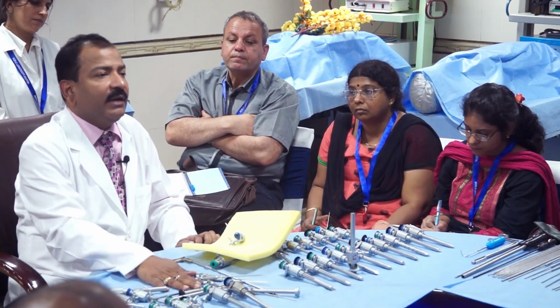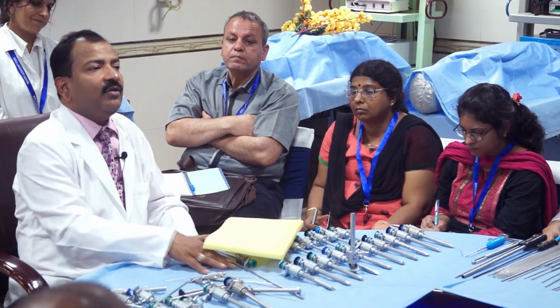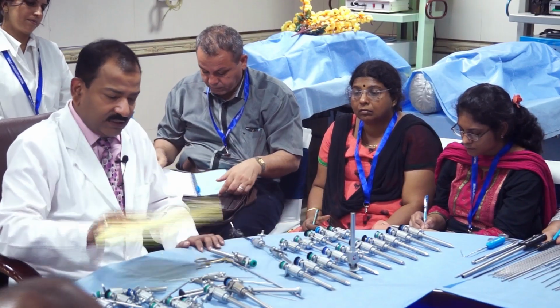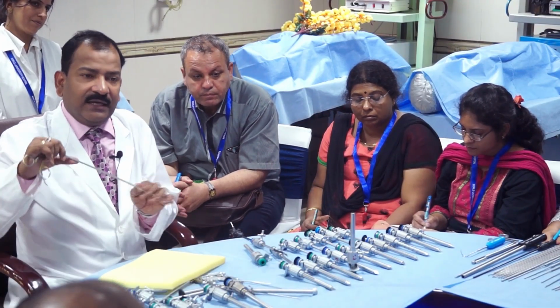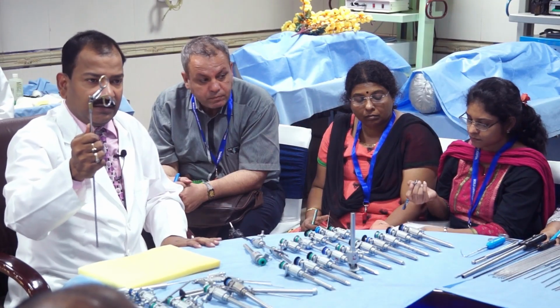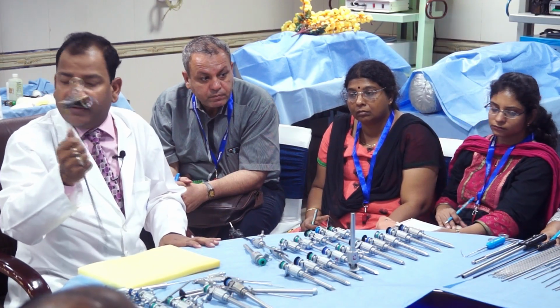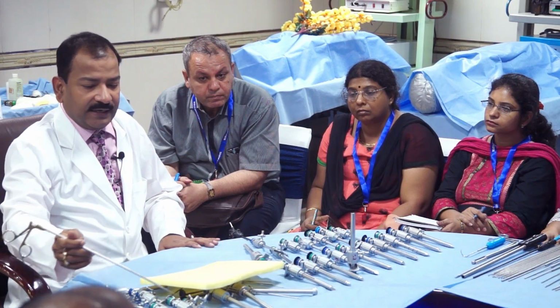Even if you make an omelette, I will give you a plate, a stove and an omelette. You can only make an omelette if your fork is at a 30° angle. Suppose this is the omelette and this is your instrument. I will tell you, okay, you make the omelette, but keep your fork always at 90°. Can you turn the omelette on the other side? Never, you cannot lift it. But if I give you 30°, you can go and make it like this. And again you can turn it this side, turn it that side.